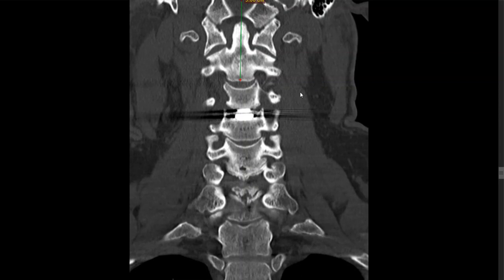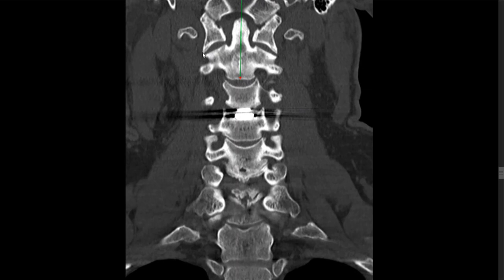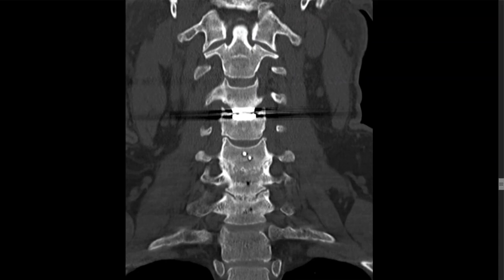What that means, trying to see if there's any. See, these are the points where you want them to line up, but you can see that C1 is kind of slightly lateral of C2, but it might be more of those rotations that we were talking about before. You can almost eyeball it and understand that the relationship between C2 and C3 is not good. So C3 is set back, as I mentioned before.